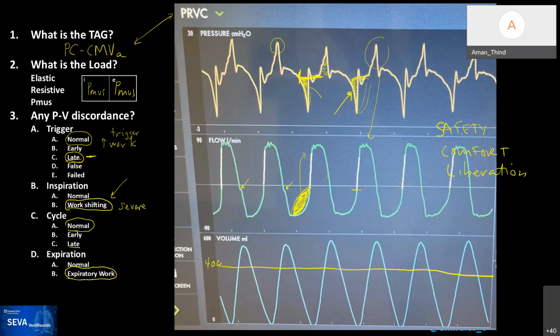So like we discussed, essentially right now the patient is getting no support, maybe even negative support in this mode. With pressure support, it will at least guarantee some support from the ventilator based on the degree of pressure support that you set. And since the patient is so active, you would probably have better flow synchrony with pressure support versus CMV or pressure control. So better synchrony, more support, and then we can titrate the degree of pressure support up as needed based on patient comfort, and take it from there.